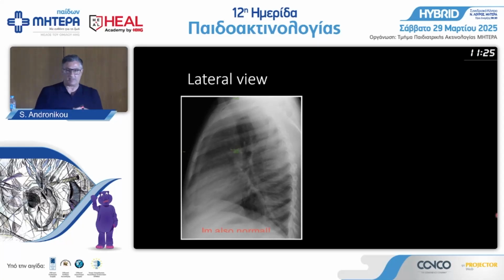So I'm going to show you some things. If you have a TB patient, I advise you to get a lateral. Okay, suspected TB, travel, a migrant, patient looking for citizenship, a patient who's sick and parents tested positive across the road, something like that. So where I put the C is where the carina is. It's not lower down. Where you see the circle, that's where the right upper lobe bronchus came off. Where the right upper lobe bronchus came off is just after the carina.